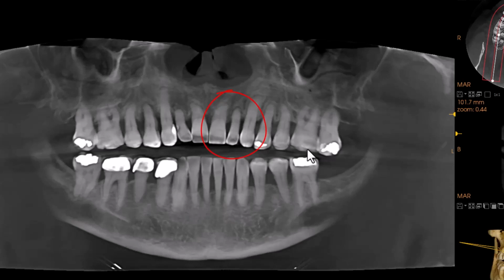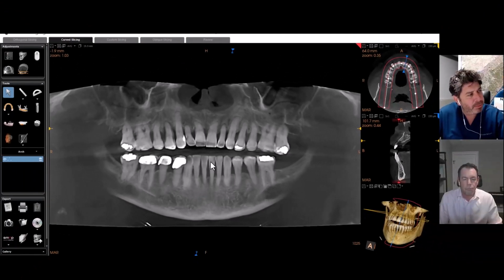Tooth number 10 is loose because it already had about 80% bone loss. So this is tooth number 10 in cross section. This is labial. This is the nasal floor. This is the palate going back, lower incisor against it. So this patient bit into something, again, with minimal bony support to begin with. The tooth is now loose, highly mobile, and the patient is upset about that. Actually, a very nice patient, but upset about his loose tooth.